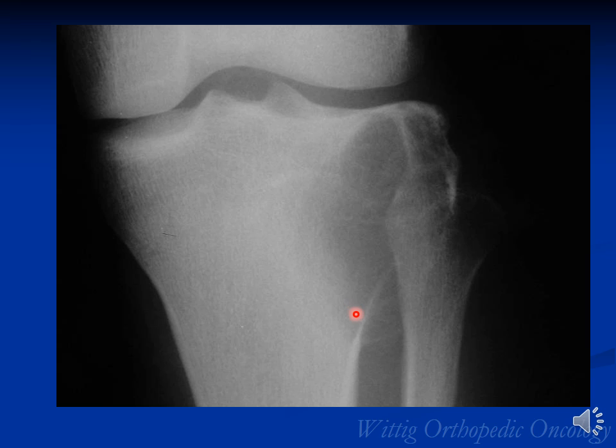This is a giant cell tumor. You can see this is a tumor that's developed in the metaphysis, extends into the epiphysis, and has extended into the soft tissues, and there's a geographic pattern of bone destruction, or a sharp zone of transition between the tumor and adjacent bone. You can tend to see internal trabeculations in here, and there's an eggshell rim of calcification around the soft tissue component, indicating this is likely benign.